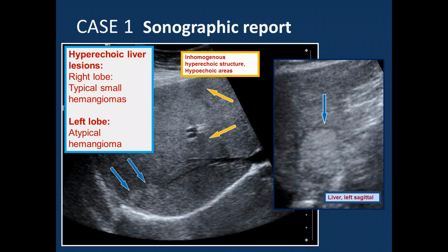This is the most common finding you will see in sonography of the liver, just hyperechoic, somewhat homogeneous little rounds. And if they are more atypical, larger, the classical finding of being sharp without a halo is almost lost, and you will see later on how the hemangioma behaves in CT and MRI, because these are the classical settings then to do a further workup.